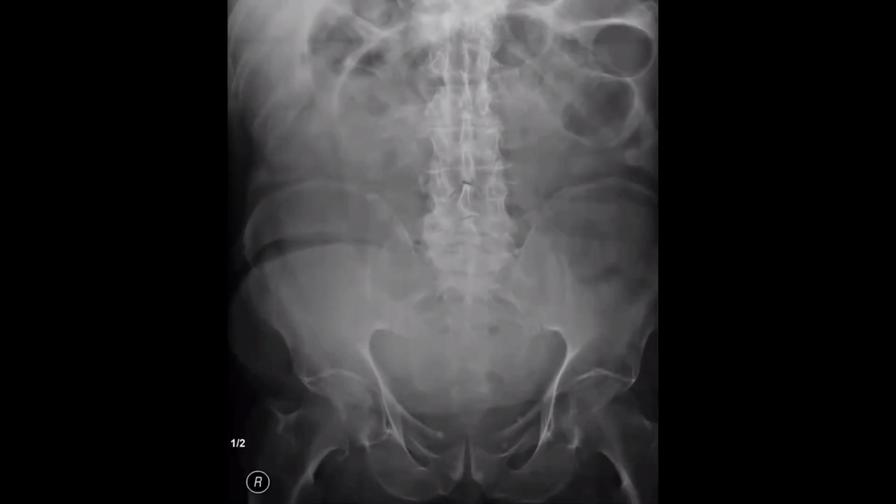Okay. So I have been provided with the X-ray abdomen frontal projection of a female patient who has presented with abdominal pain, and I can see that there is a dilatation of the large bowel loop in the region of the transverse colon. Is it large bowel or small bowel? Sir, it is within the center of the abdominal cavity, and there are multiple valvulae conniventes also seen. Yes, you are right. I am concerned for small bowel obstruction, with a coin stack appearance.